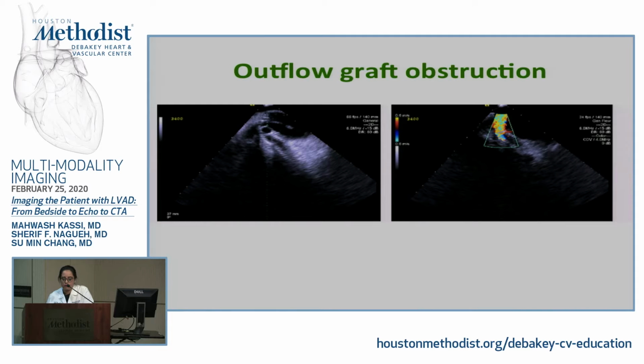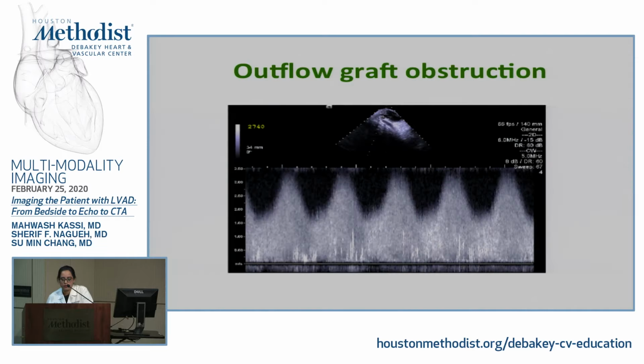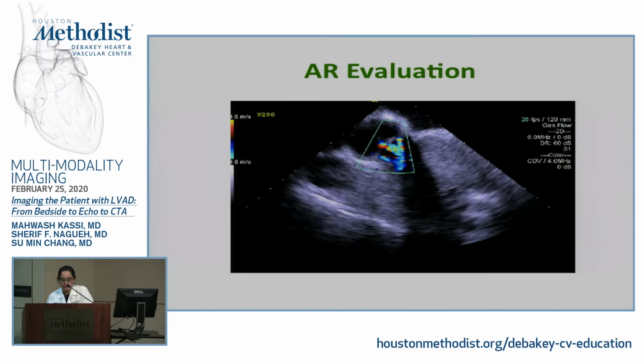and get better views of this, because we do experience a lot of issues with LVAD unloading because of the outflow graft, where it can get kinked or it's obstructed. And of course, for the quantification of aortic regurgitation, it's important to look at the outflow graft and the Dopplers through the outflow graft. Again, this is aortic regurgitation, somebody who has 3 jets with AI.